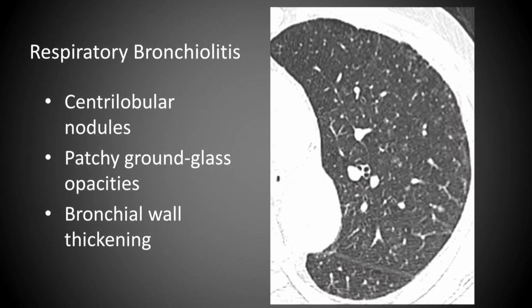So here's another example where when you look closely, you can just see these little ground glass nodules. You can distinguish them from pulmonary vessels, which are separate and branching. We may see patchy clumps that create ground glass opacities. You may see bronchial wall thickening. And then sometimes you'll see a little bit of tree-in-bud. These will just branch a little bit. Again, strikingly upper lobe predominant.